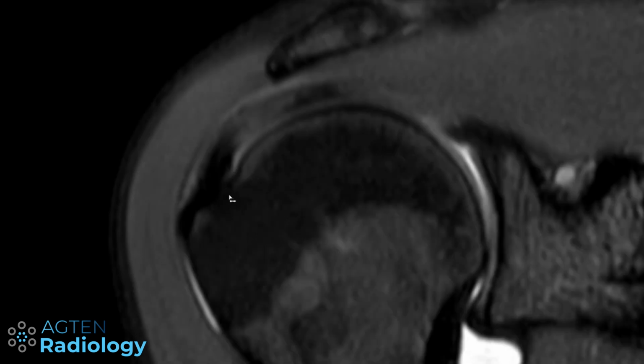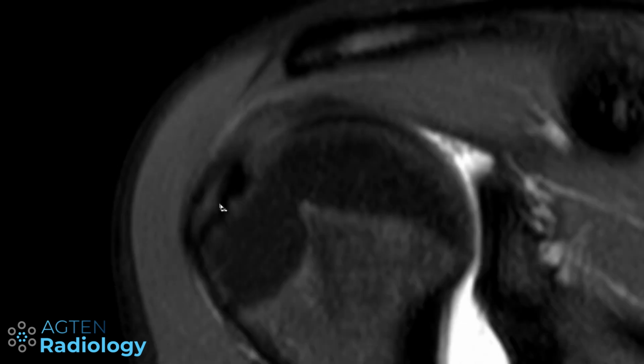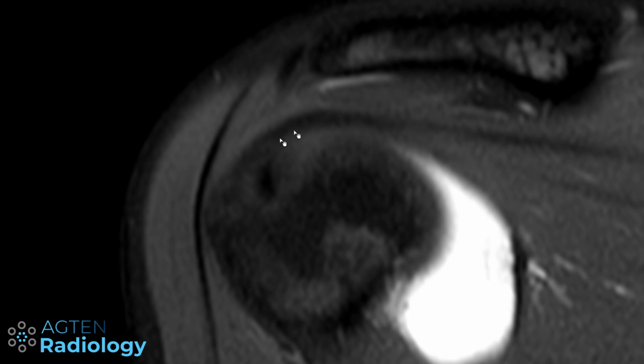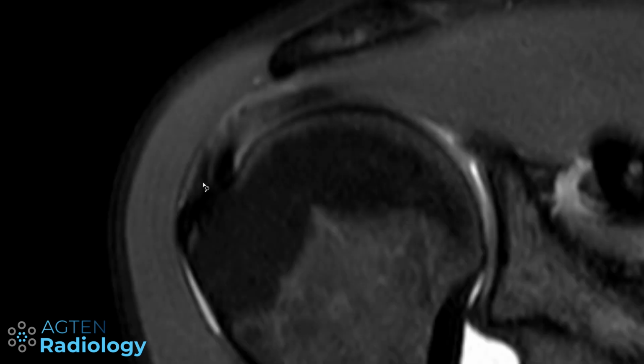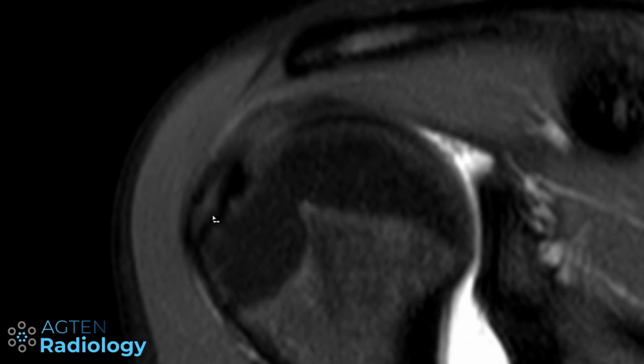And if we scroll posteriorly, we start to see a slight signal change, which is now the crossing or the overlap between the supraspinatus and the infraspinatus tendon, as you can see if we scroll further back. So this one here is already infraspinatus tendon, which is then overlapping portions of the supraspinatus tendon, as you can really nicely see here. Now, if we scroll posteriorly, we can see some changes here.